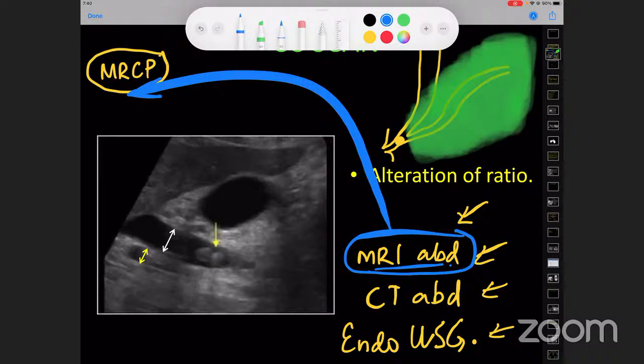All right. So actually, MRCP means we do an MRI of the upper abdomen with MRCP. It's not just the MRCP sequence, that is actually the HASTE sequence, heavily T2-weighted coronal sequence, where we can see only the biliary tree, gallbladder and pancreatic duct. Nothing else is visualized.